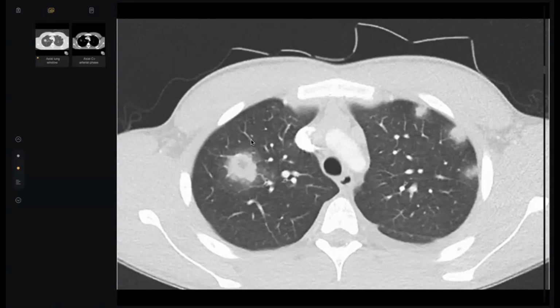No, doctor. This is a mass or a consolidation, and outside the mass there is ground glass. What you see in the center here is not ground glass. This is something else. Could you tell me what is this in the center? It could be due to necrosis. What is the type of this mass? Necrotic mass lesion, cavitary nodule. Okay, cavitary nodule. Give me differential diagnosis.